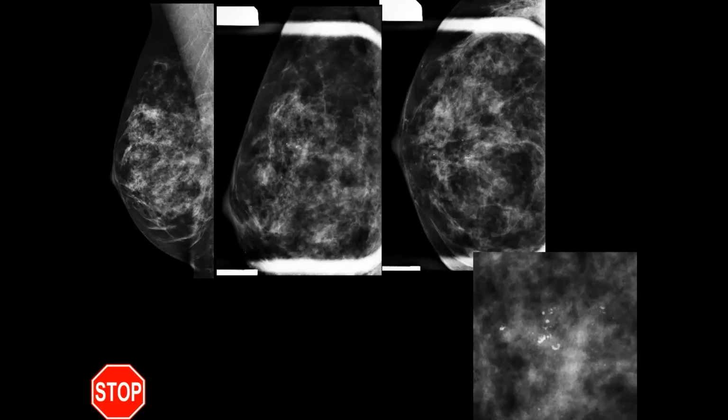And I also call them shrapnel calcifications because it almost looks like a bomb goes off. And so if a bomb explodes and shrapnel goes all over the place, it's in all different shapes and sizes. It's not uniform, right? And is a bomb a good thing or a bad thing? It's a bad thing, right? So that's how I remember this. Shrapnel calcifications, all different sizes of shrapnel, bad, DCIS, okay?